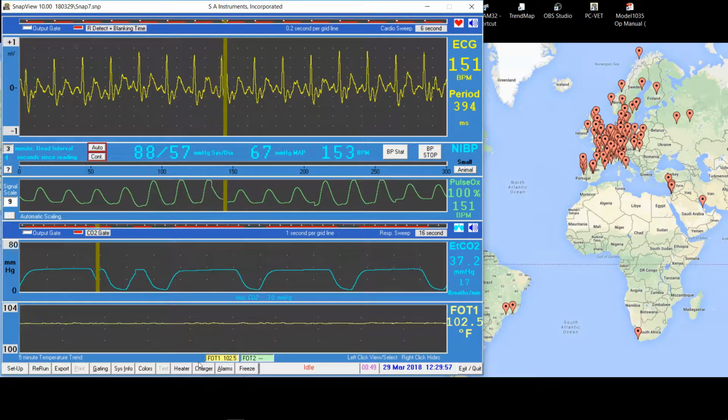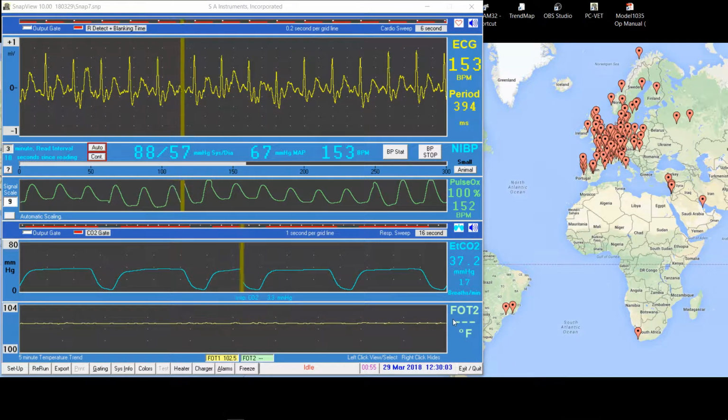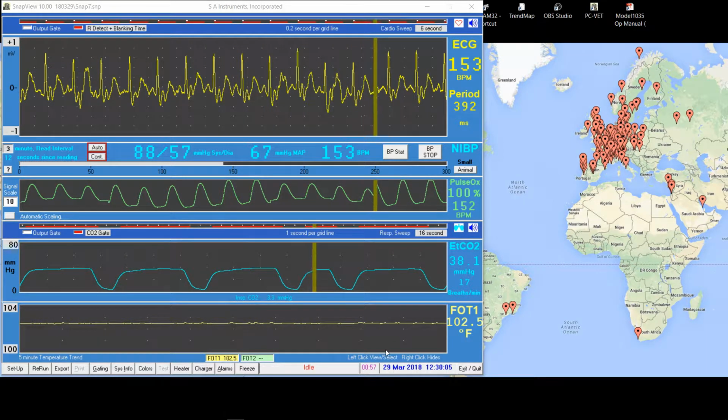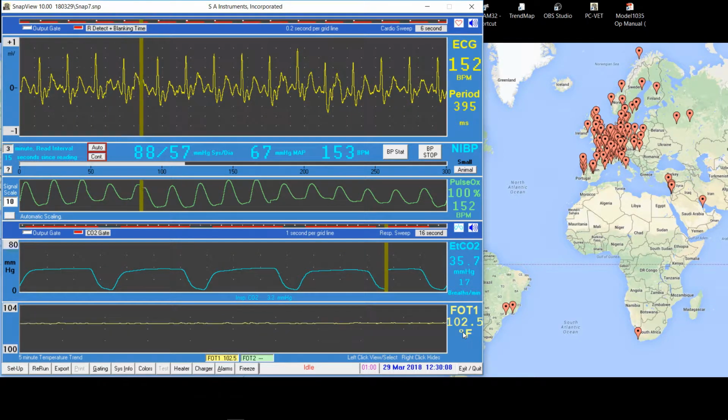2 buttons appear at the bottom of the display. These buttons select which measurement is displayed in the trend and displayed in the digital display at the right. Toggle between degrees C and degrees F by clicking on the unit indication.